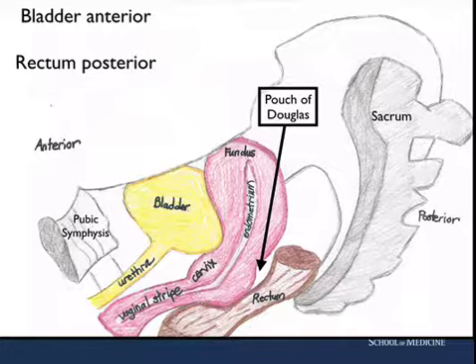There will be a concavity seen between the cervix and uterus in an anteroverted uterus. We can identify a hyperechoic vaginal stripe, which leads to the cervix, and the hyperechoic stripe of the endometrium.